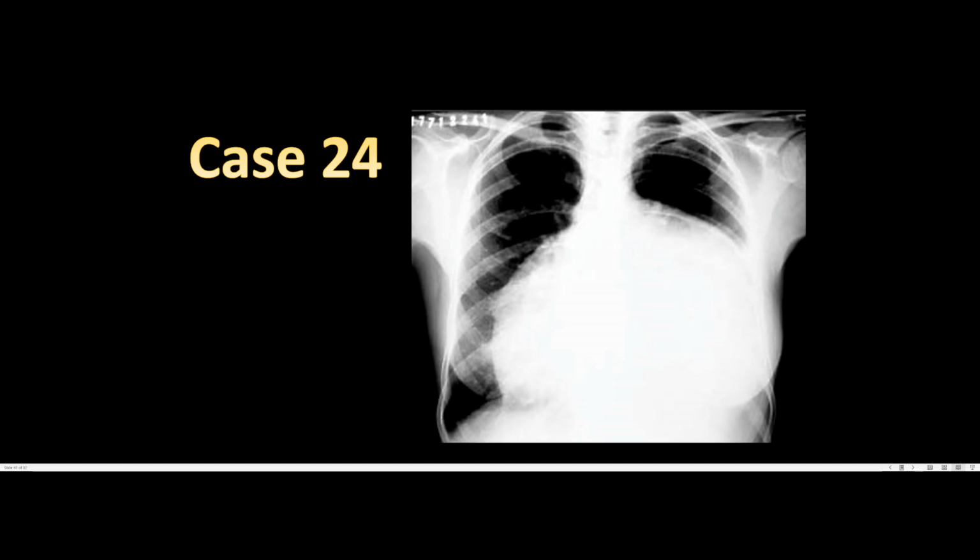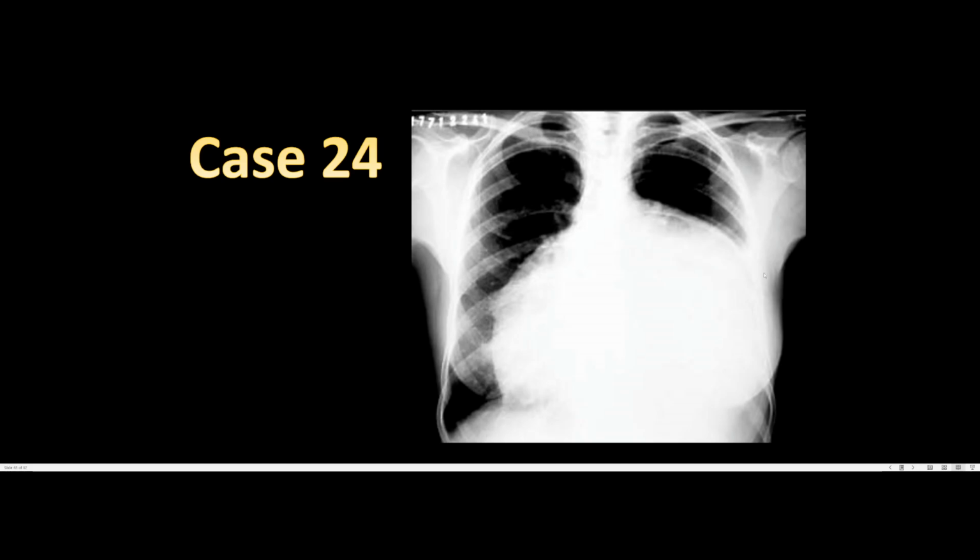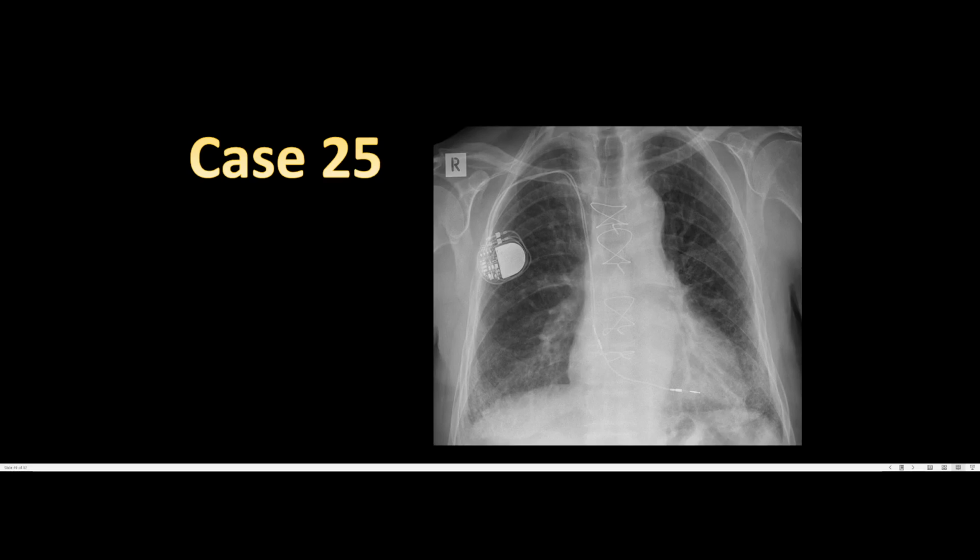You'll say pericarditis. But this is pericarditis, which eventually is complicated with pericardial effusion, and of course with accumulation of fluid surrounding the heart. You will notice it takes on the appearance of a globular shaped or water bottle shaped heart. Is this confirmatory? Not really. You can do an echocardiogram to confirm the case, but again, X-ray can help a lot in localizing the diagnosis. All right, so this is a case of pericardial effusion due to pericarditis. So that's pretty much it for this case.